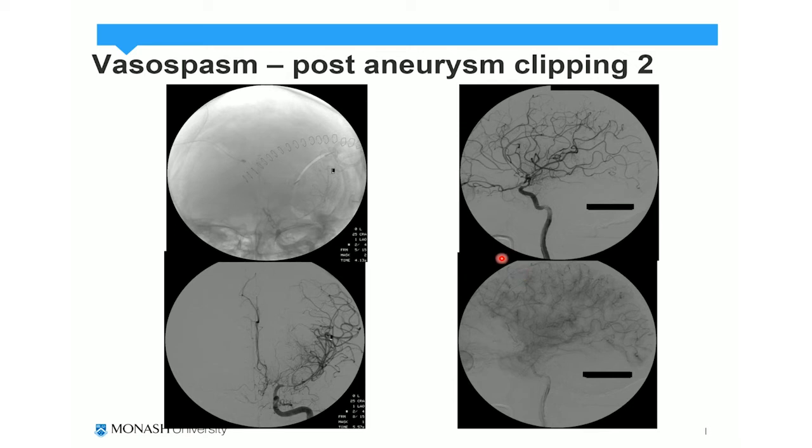There's a different patient here, similar indication though for vasospasm. We're seeing narrowed vessels all the way along the anterior cerebral. When we look in the PA, we've got anterior narrowing and middle cerebral artery narrowing. When we look in the capillary phase, what's interesting is we've got a wedge artifact where we should be seeing perfusion. So a vessel that's come off the middle cerebral, anterior temporal, or a vessel from the anterior cerebral has actually vasospasmed so much that it's occluded, so we're not getting flow into that area. You see that big wedge artifact there.